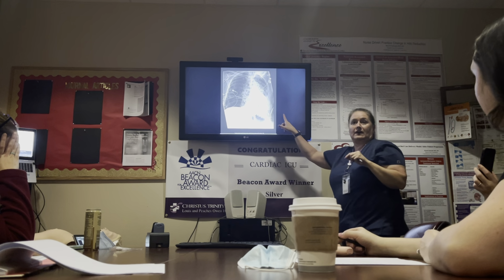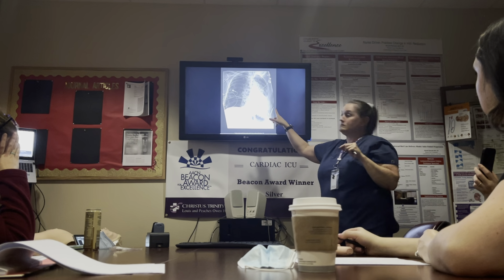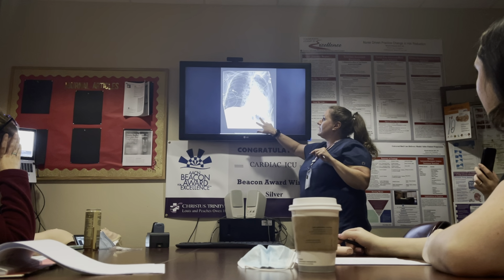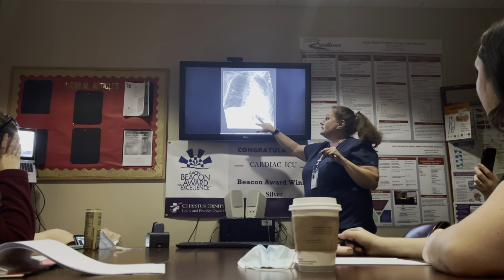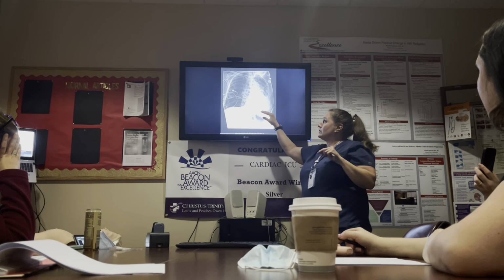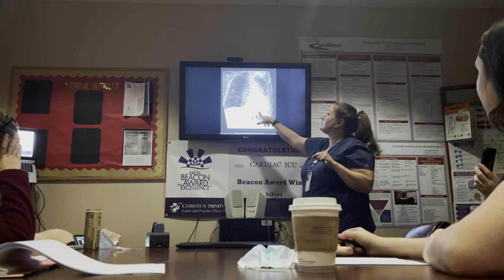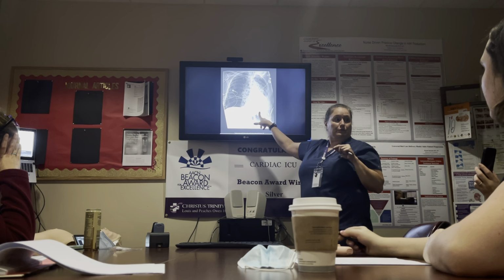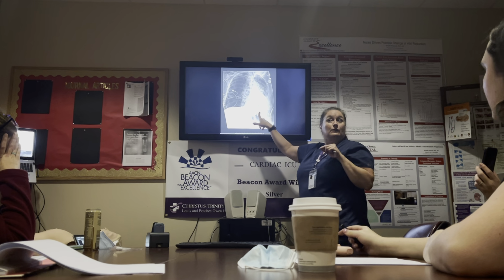And that probably had tube feeds that went into the lung, okay? So you're seeing some of the air here. There's some air bubbles in there. This is actually below the diaphragm here. So you don't see a clear, crisp diaphragm, and maybe we've had feeding tubes go through the lung and into the pleural space. We've had one just recently.